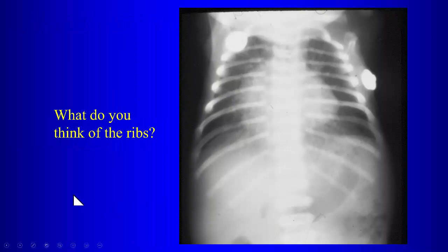Now in this particular case, I'm asking you to look at the ribs, and when you look at the ribs, what do you notice? By the way, anybody can answer, even if you're out in virtual land, all right? So we'll open this up to the whole group as I ask questions going along. Anything about the ribs? How about we count the ribs? All right, so what's the significance of that?